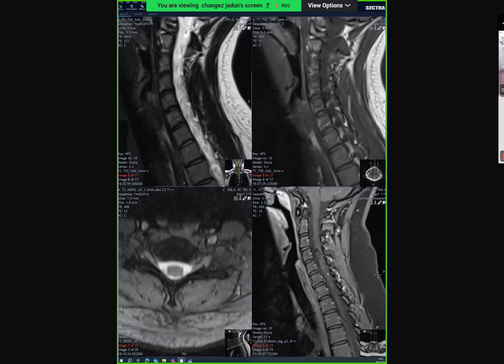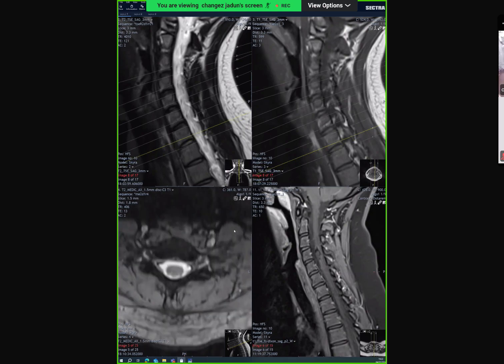But anyway, you have given me the description so far, but you have not given me the differential diagnosis of this lesion. In the differential diagnosis, this could be a small cavernoma, because there is a marked hypointense rim on T2 weighted images, which appeared more pronounced on the gradient.